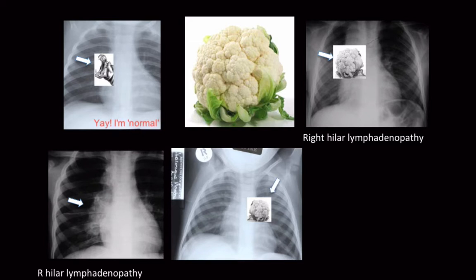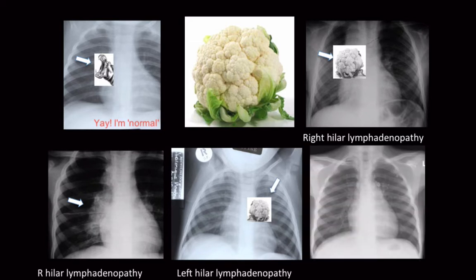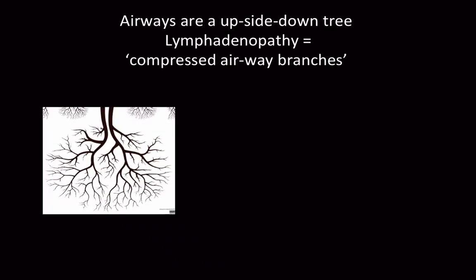My last point is about identifying calcified lymphadenopathy. That's a calcified lymph node in a patient with a Ghon complex and a Ghon focus. You can see the calcification quite easily in this case, but I want to assure you that it's not so easy most of the time. And we rarely see calcification nowadays, even on CT scanning, which is much easier to detect calcification. If you see it, you've got tuberculosis probably, but if you don't, this is not the thing you've been waiting for.